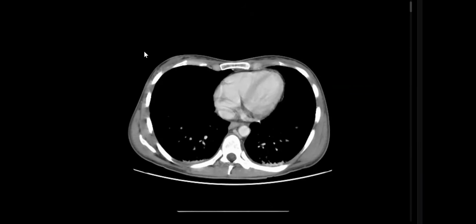Yes. Now we have another category of cases. Middle-aged female, pain and fever. Okay, I am provided with the CT scan of the abdomen, axial slices, in a portal venous phase of a female patient who has presented with pain and fever.